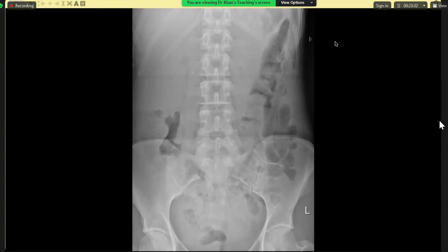This is the X-ray abdomen frontal projection of a female patient, in which I can appreciate a small foci of calcification in the bilateral lumbar regions, which can be in the kidneys or pancreas. Next, I can find the haze, which is displacing the transverse colon inferiorly. And the bowel gas pattern is non-specific. There is no evidence of free air or pneumoperitoneum. Visualized bones are normal, and rest of the structures are normal.